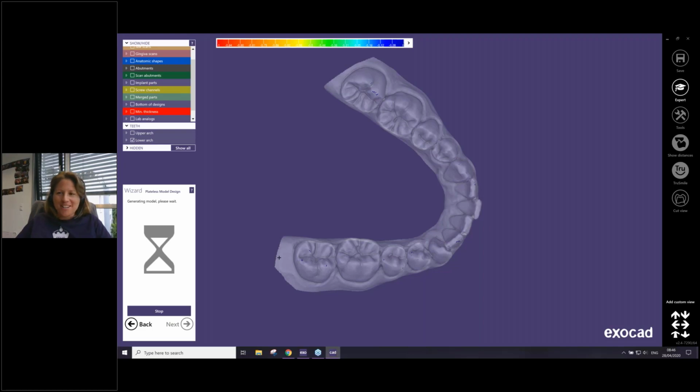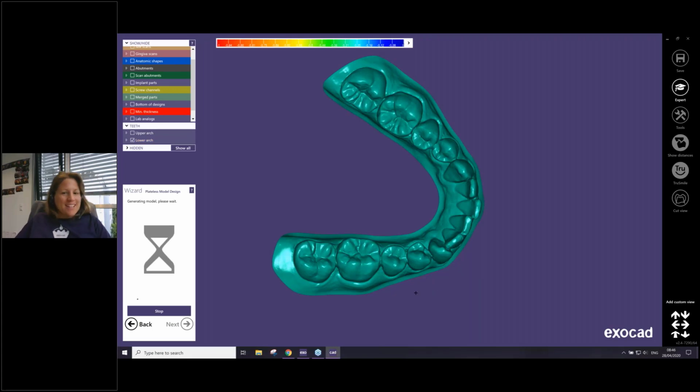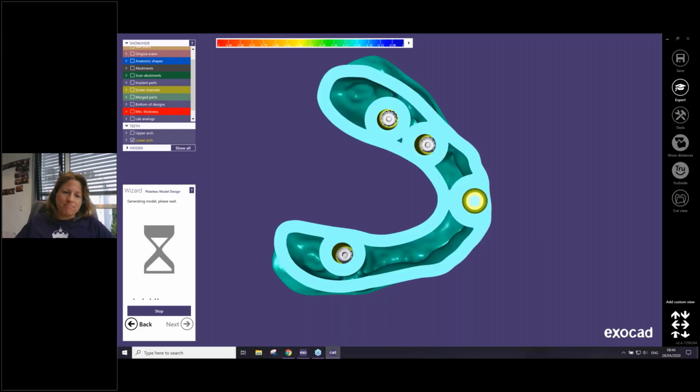No. Okay. So there was a question, for example, how to rotate the text on the model, but it's pretty clear. In the freeform step, you can add attachment as text and you can rotate it freely. It's not a problem. But with the text option, it's in position.